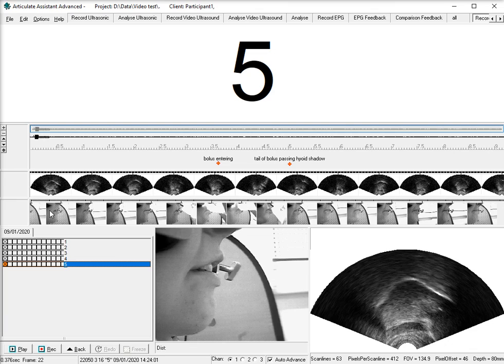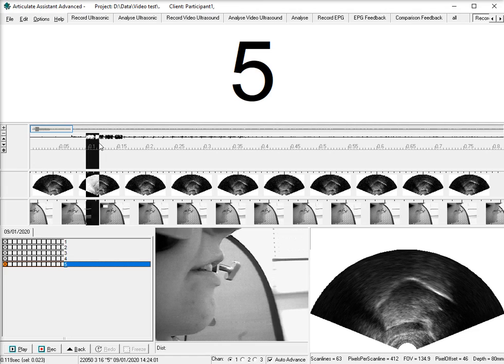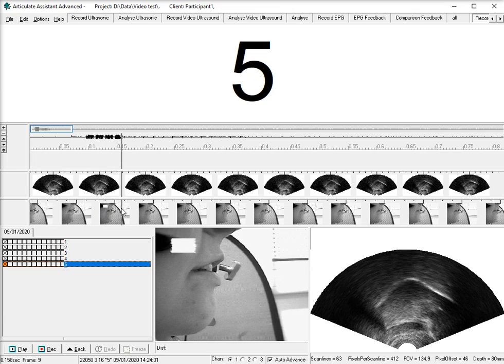Close this. We can look through this recording. Now we should see where it goes black in the pulse at the top here. If I zoom in on this, we should see for these 4 pulses here, we should see in the image 4 bright squares, and then when we get to the end of these 4 pulses it should stop, and that's it synchronized.